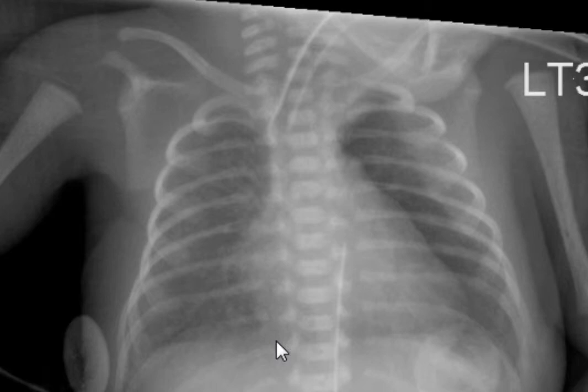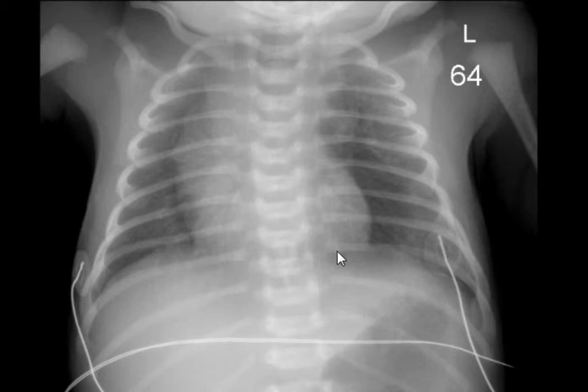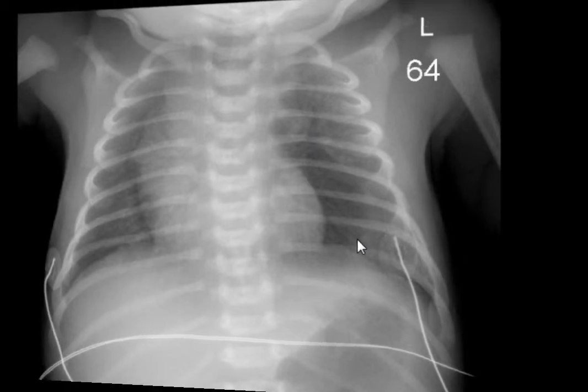There is no visceral pleura inferiorly or laterally. You don't have to see that. This patient has medial lucencies on both sides, small on the right, outlining the right heart border, a little bit bigger on the left side. Bilateral medial pneumothoraces, left greater than right.